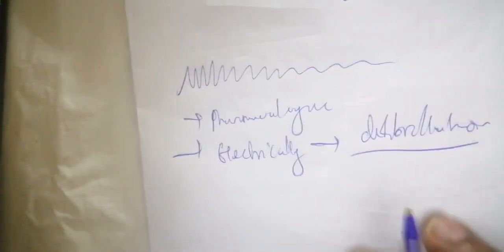So we have already seen all the major signs. Lastly, what I forgot to tell you is that U waves can also be found in hypercalcemia and in patients at extreme ages.